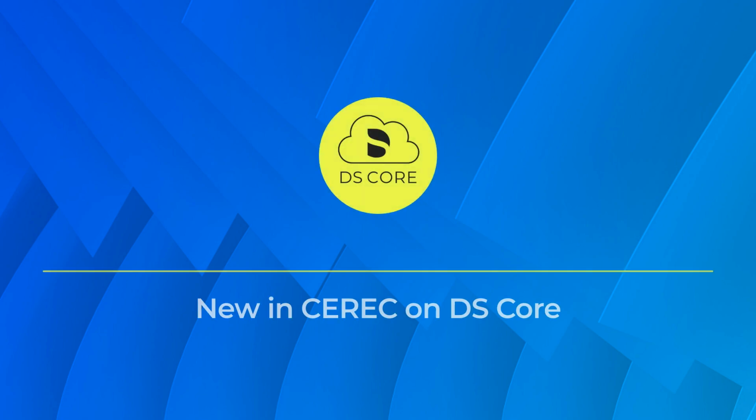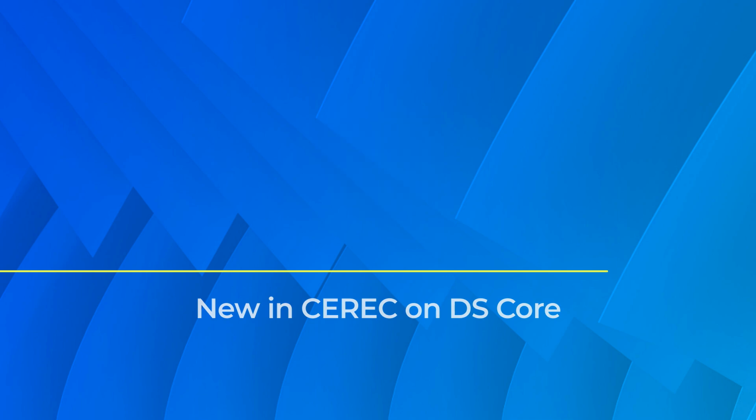The following tutorial describes the latest improvements in the cloud-powered CEREC workflow. Let's begin. Here's what's new in this release.